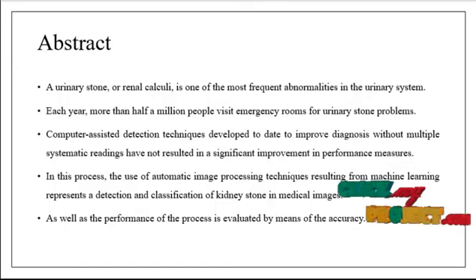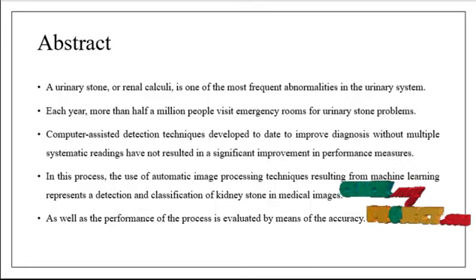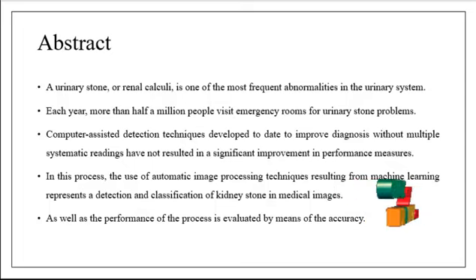In this process, the use of automatic image processing techniques resulting from machine learning methods represents the detection and classification of kidney stones in medical imaging, and the performance of the process is evaluated by means of accuracy. The overall process has three stages: segmentation, feature extraction and classification. By these three steps, the project plays a major role in diagnosing whether the urinary stone has occurred or not in the medical images.